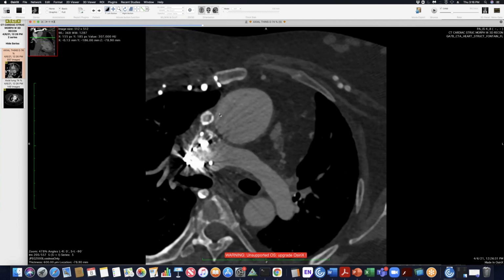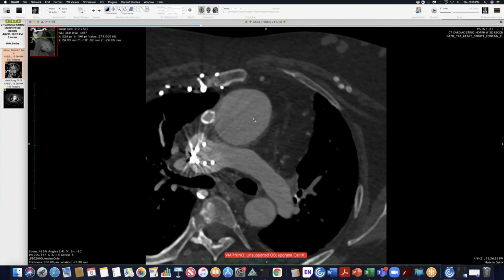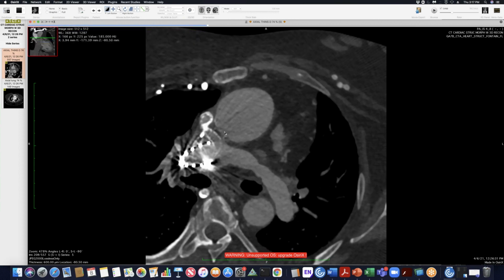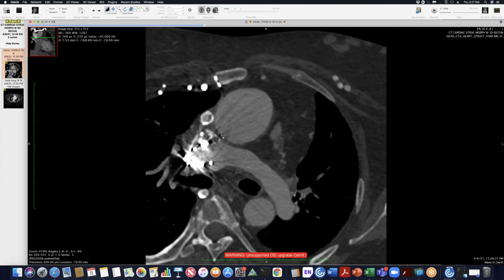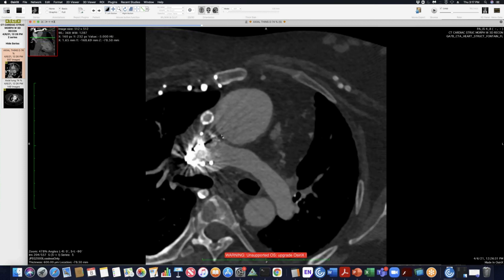I didn't see in any of the literature a connection from RPA to aorta. Everywhere it said LPA to aorta, and even in the notes it said that the patient has a left pulmonary artery to aorta POTS shunt, but that's not what it looks like in the images. So I think the surgeons just decided arbitrarily to do it on the right side this time.